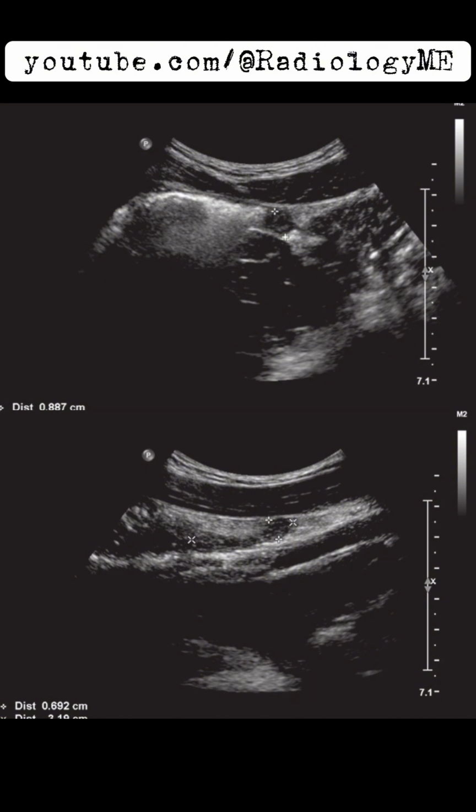In terms of management, this ultrasound finding would lead to a prompt surgical referral, particularly for patients with compatible clinical findings of acute appendicitis. While CT may be considered to rule out complications, such as perforation, in cases where ultrasound is inconclusive, here the ultrasound findings seem fairly conclusive, so surgery would be the next appropriate step.